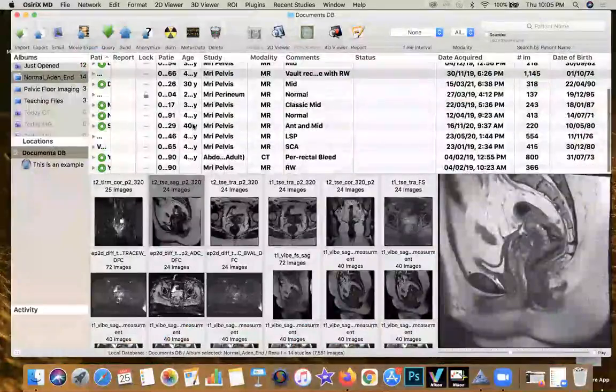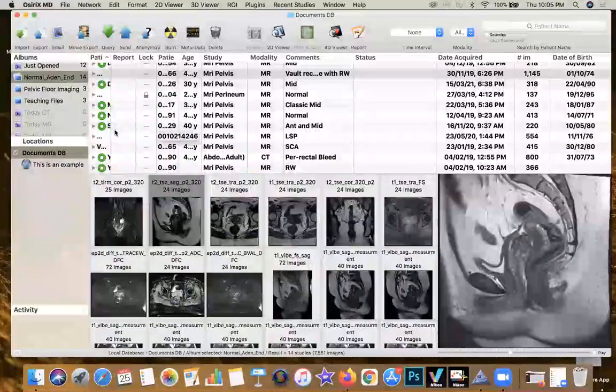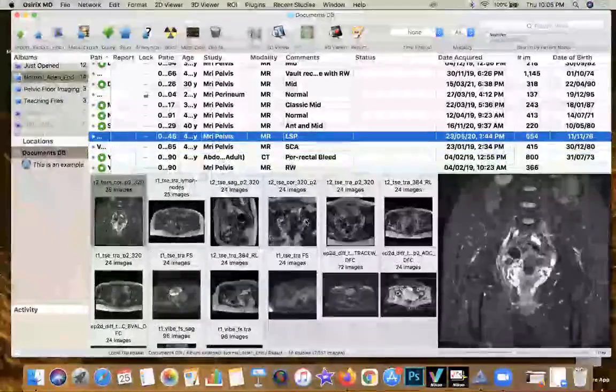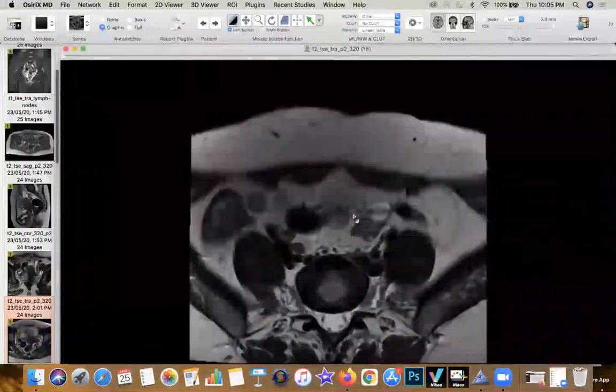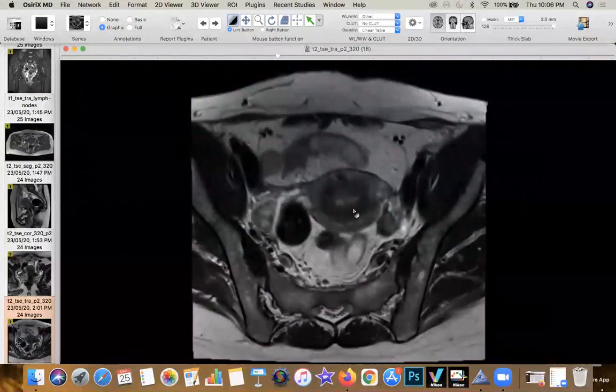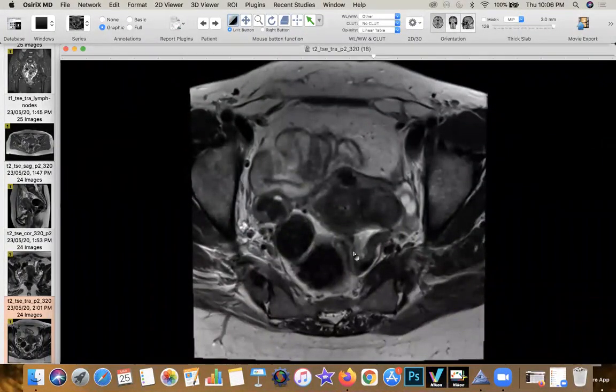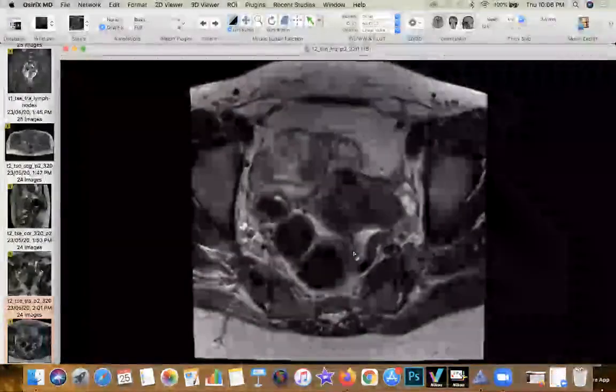I'll show you all a couple of more cases, and then probably I'll end the session. So the first battery of cases, if you look carefully, had the typical uterine involvement, the ovarian involvement, and of course, I've shown you all the rectal, the vaginal, the recurrent vaginal, as well as the bladder involvement.